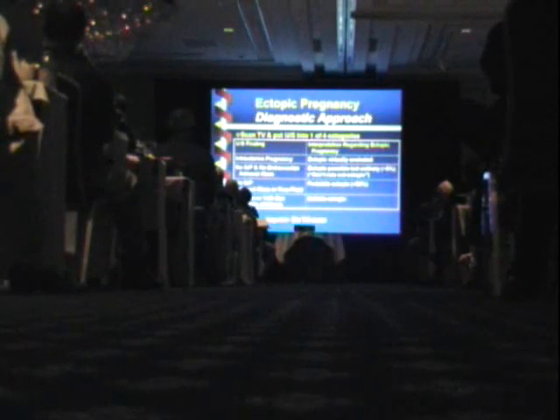If the transvaginal scan is inadequate, for instance there may be a fibroid in the lower segment you can't see through too well, do a transabdominal scan. And if the transabdominal ultrasound is equivocal for an adnexal mass, which doesn't happen too often, it can be useful then, and only then, to do Doppler.